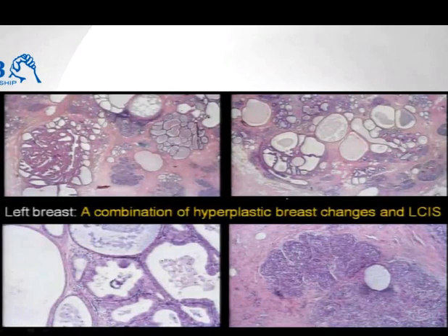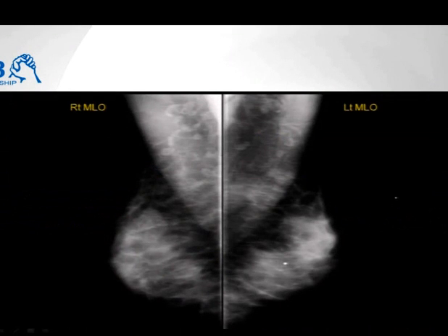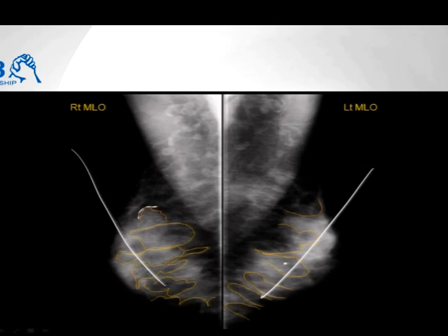So the surgery is done, and you see the whole pathology book here: papilloma, cysts, and lobular carcinoma in situ. So actually, what she felt was the cysts. But what is the teaching point here? The teaching point is that a good radiologist doesn't look at the white, the radio-opaque on the mammogram, but the radiolucent. And you see how concave everything is? But this is concave, and this is convex.